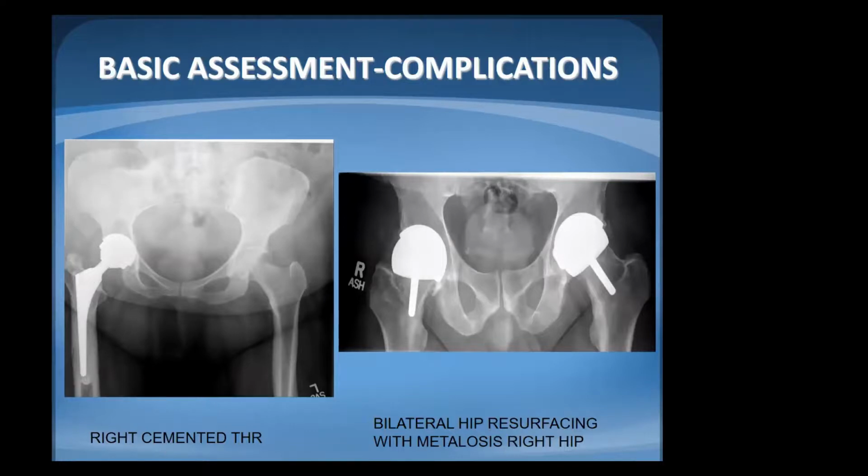This is a resurface. We've seen this picture, which is a little bit abnormal in terms of placement and angulation. But let alone this, I'm going to draw your attention to the soft tissues here, and you can see not really bone or body debris, but abnormal, spotty, soft tissue inclusions, which are actually a find called metallosis.